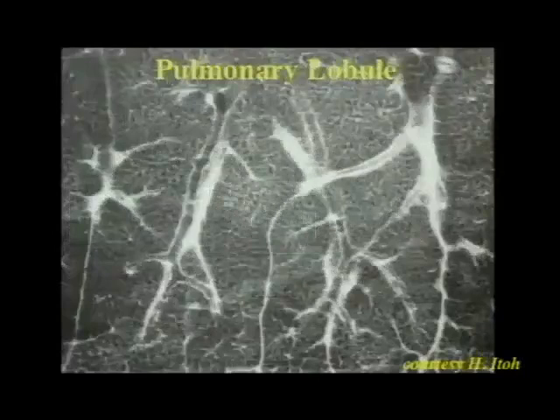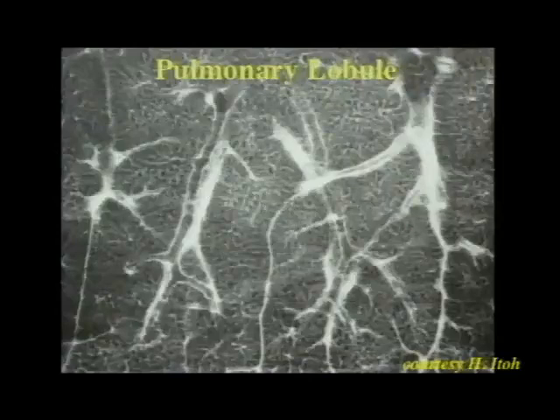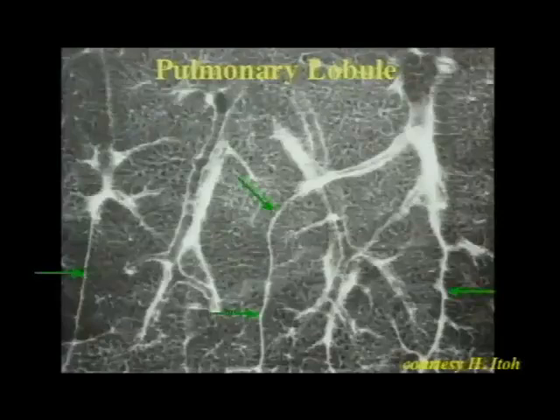Now, I'll begin with a brief description of the secondary pulmonary lobule. A number of the abnormalities I will discuss are based on abnormalities of lobular architecture. This is a nice example of a radiograph of a lung slice of 2 adjacent secondary pulmonary lobules. They're marginated by connective tissue interlobular septa containing pulmonary vein and lymphatic branches. In the center of the pulmonary lobules is the centrilobular artery.